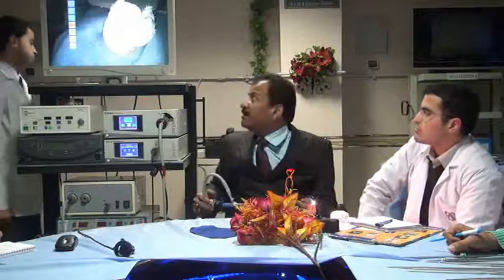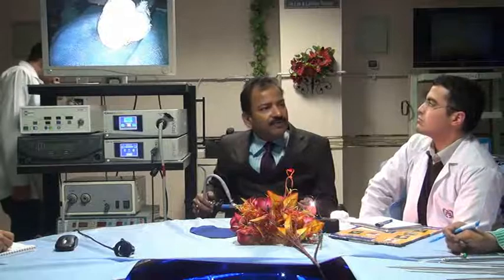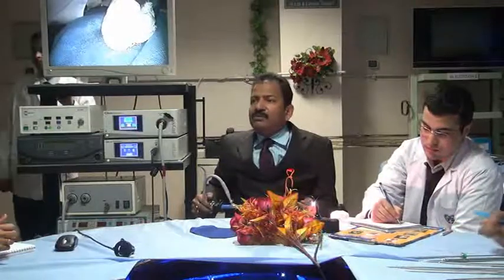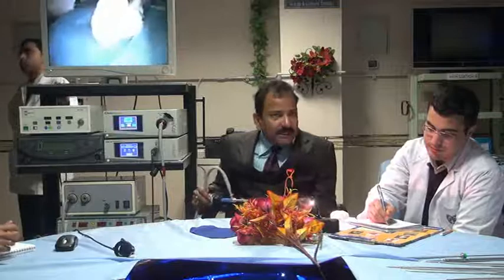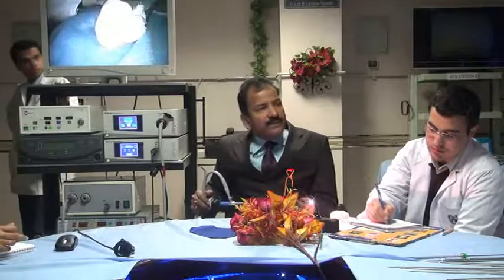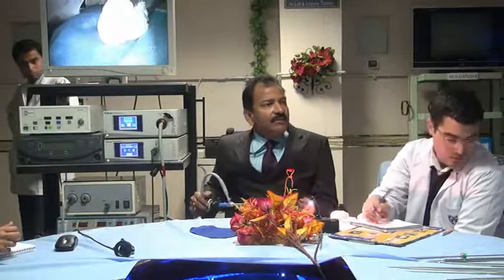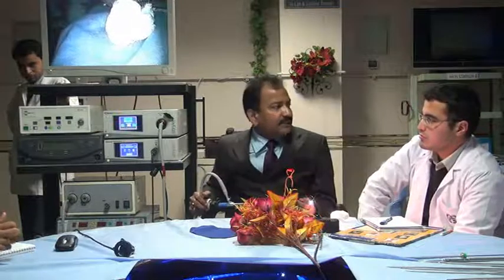You know why? Because if you see very carefully, 40% is absolute and 60% is the surrounding. During surgery, we want to see the relative anatomy also, so that we will not perforate, we will not overshoot, and that is possible only at 10 centimeters. That's why all the companies agree that for a 10 mm telescope, the surgeon is more comfortable at a distance of 10 centimeters. So let us make a prism which should have the focal length of 10 centimeters.